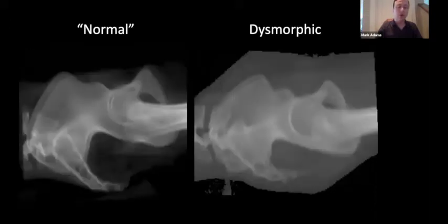Note a quality pelvic lateral has overlapping greater sciatic notches and matching iliac cortical densities. This line marks the iliac cortical density. For the osseous fixation pathway and neural tunnel of the first sacral segment of the normal pelvis, I have marked them here.